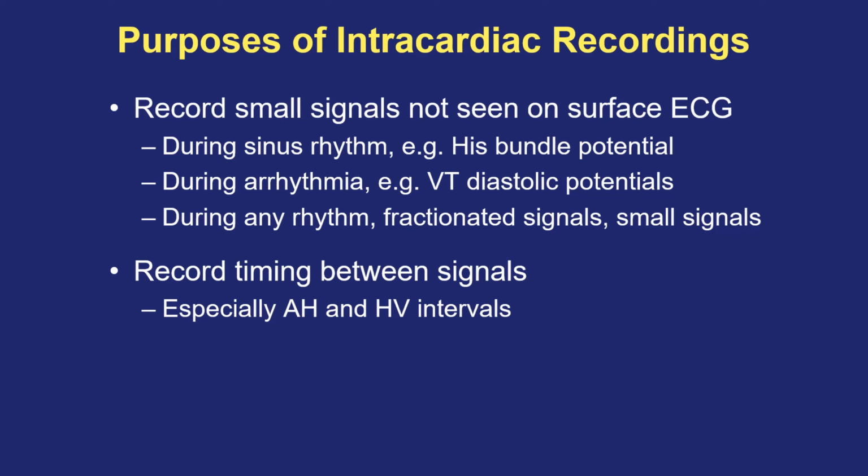The first part, the segment that goes through the AV node, and the second part, the signal passing through the His-Purkinje system. And that can be important in detecting certain disease states, especially when there is clinical evidence of signals not able to get from atrium to ventricles, and you want to know the consequences of that second-degree AV block.